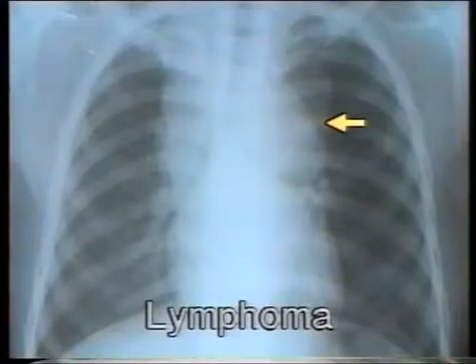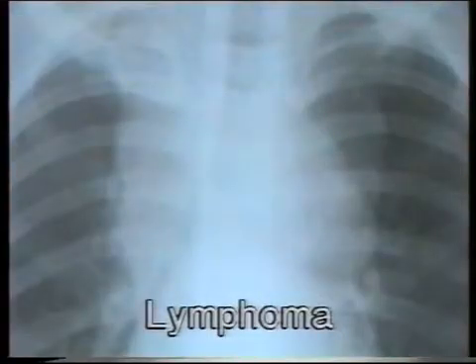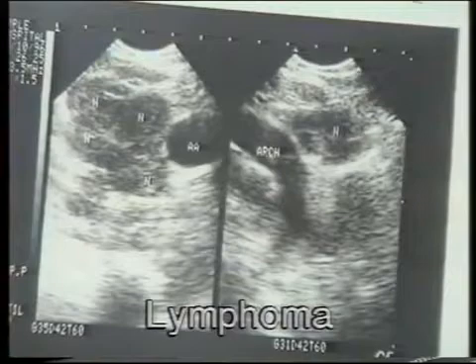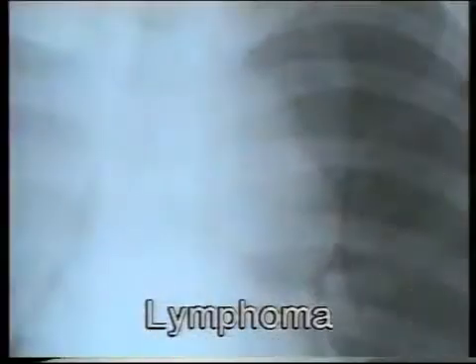This mediastinal mass showing bilateral widening has a characteristic lobulated border, especially on the left side. This is a lymph node mass. Such large and bilateral lymph node masses are almost diagnostic of a lymphoma. Lymph nodes of tuberculosis or metastasis never grow to such a large size. I also have an ultrasound picture of this patient taken from the suprasternal notch showing the large and multiple lymph nodes surrounding the arch of aorta, thus confirming that this is a lymph node mass. Note again its typical lobulated border.